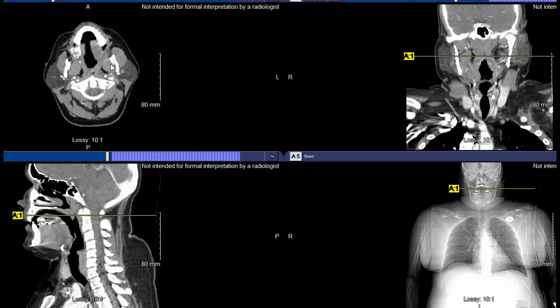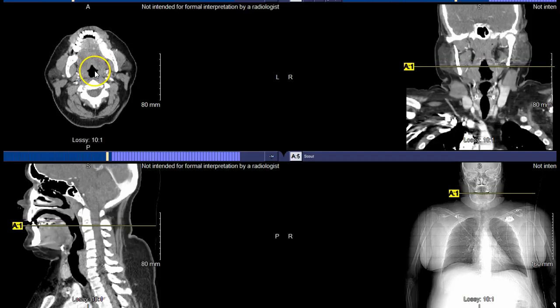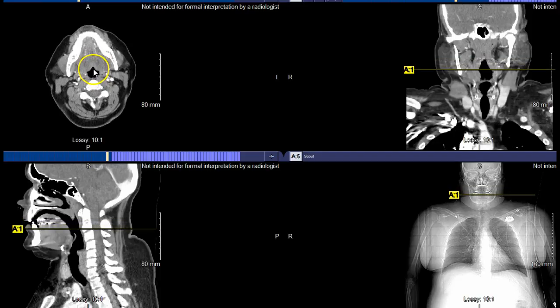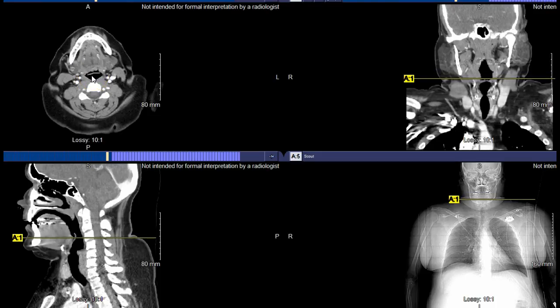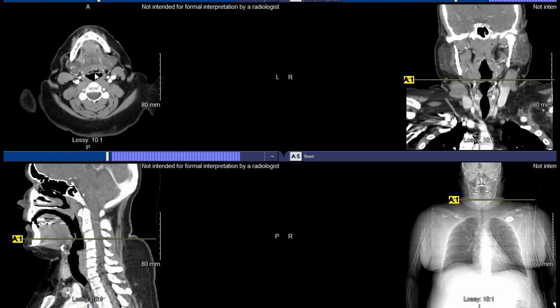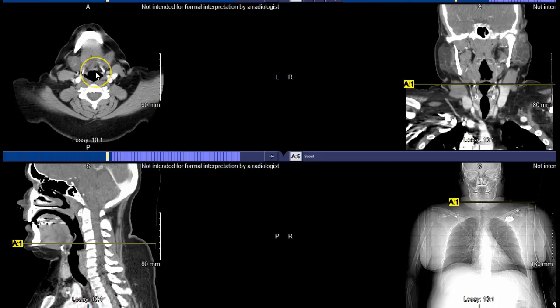Additional structures to note in the axial orientation: you can start to see, of course, this is an airway, an opening. As we continue down and follow that opening, you should be able to see one particular structure coming in here. A really easy one to identify is the epiglottis. You can see that coming into visualization on the screen, on the anterior side of the airway.